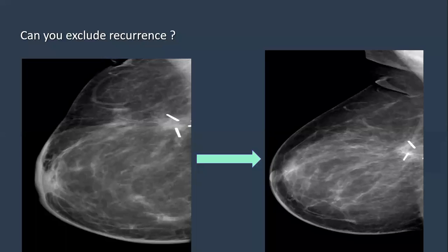It means recurrence of the mass. It means there is an underlying mass effect, something growing. I have to take it seriously. Not necessarily, this may be post-radiation change, which will regress with time, and a growing lesion would not be small enough to cause so little edematous change. So I have to take all features together, not only the edema of the breast and skin resolving. That does not mean everything is resolved. I have to look at the area of asymmetry at the scar sites and analyze it.